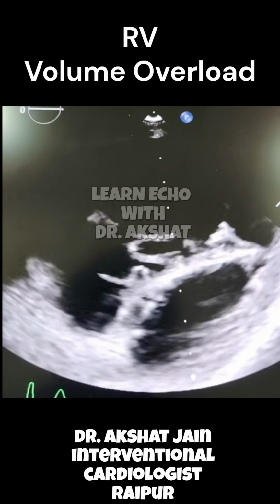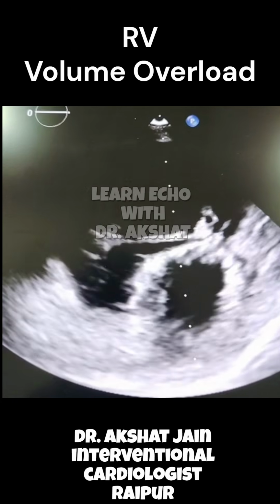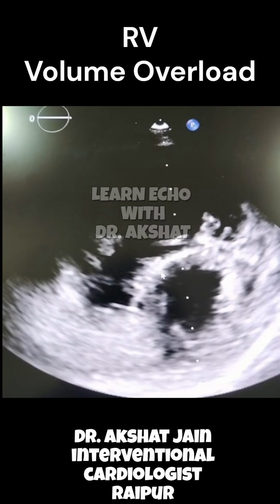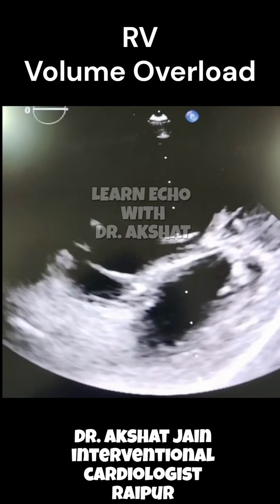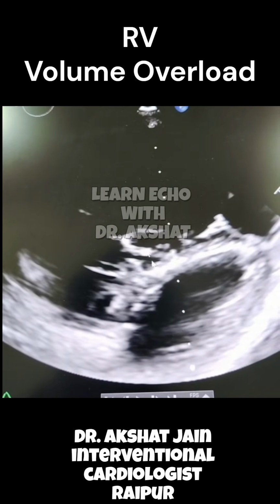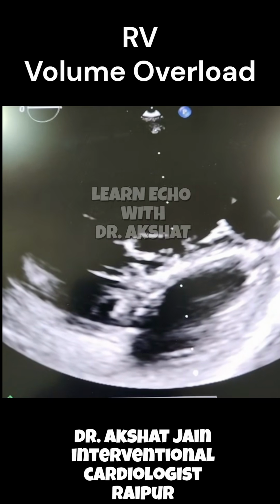So during systole, like this. Now this is systole. The LV is well rounded in shape. The septum is not being pressed into the LV, but it is instead going towards the RV. However, during diastole, the septum is pressed into the LV like right now, and the septum has become straightened and flattened and is going into the LV.